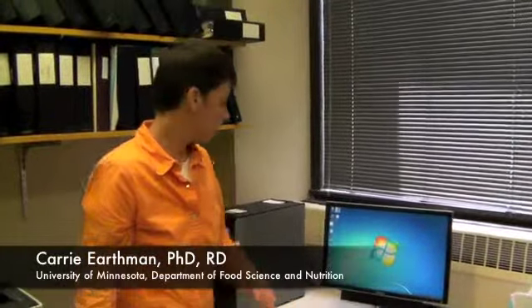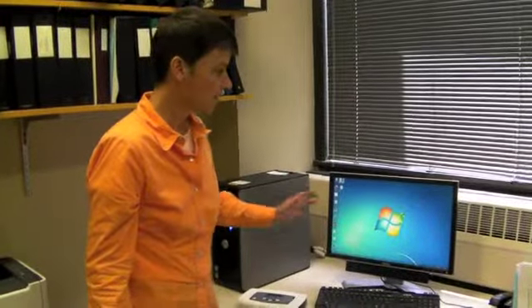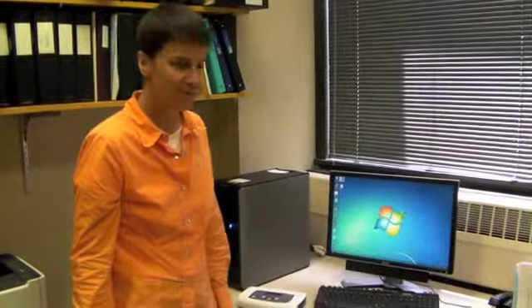In this segment, we're going to talk about how to download the data to a temporary file on your computer that's paired to the device, and I'll be helping every site set up their computer so that that will be easy to have happen. And then we'll take the data that is downloaded and I'll show you how to save it to an Excel file so that you can prepare it to send to me.